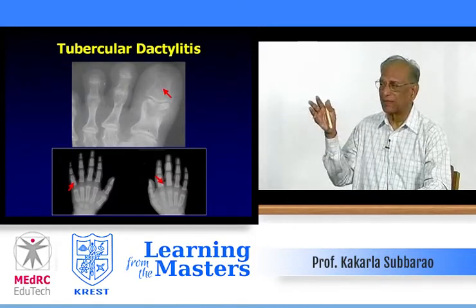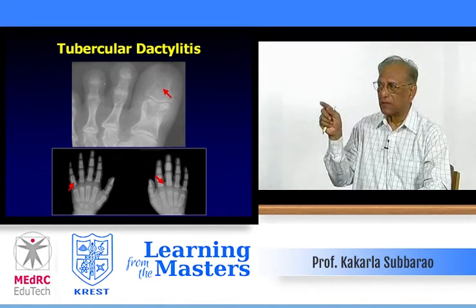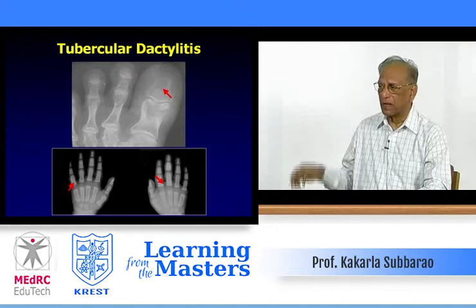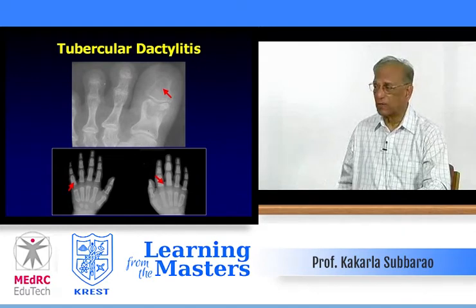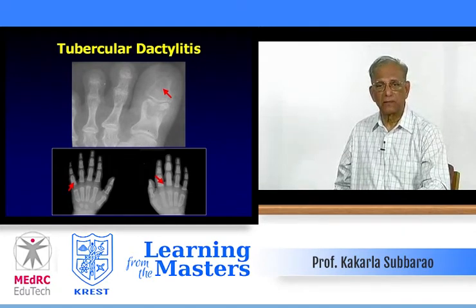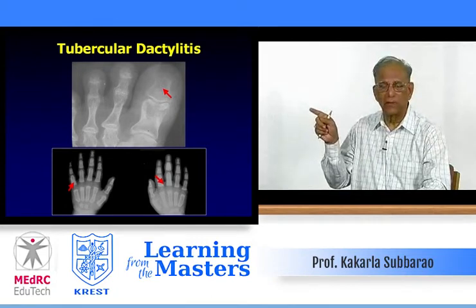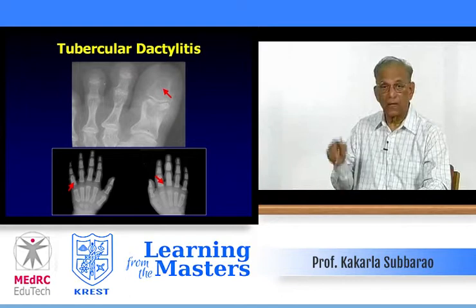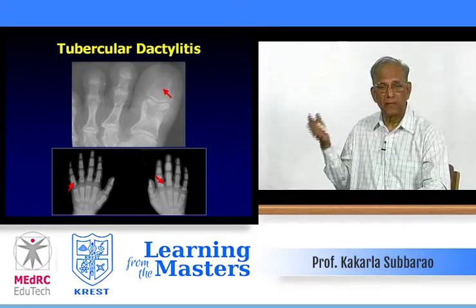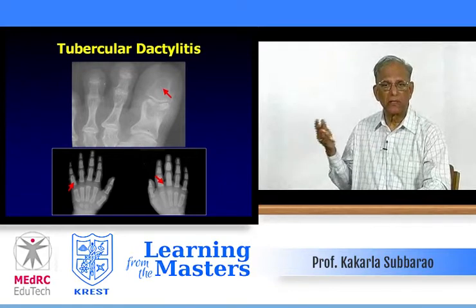Again, tuberculous dactylitis, you could see in children particularly, spindle-shaped, lytic areas that the arrows point out. And lastly, I said tuberculosis from head to toe, so I have to show a toe radiograph. Look at the proximal phalanx of the great toe. Osteoporosis of the bones is noted, lytic areas, that lytic area is going into the articular margin producing arthritis, and soft tissue swelling, proved to be tuberculosis. Why can't it be fungal? There should be intense bone reaction and sclerosis because of the chronic inflammatory change and infective stage.